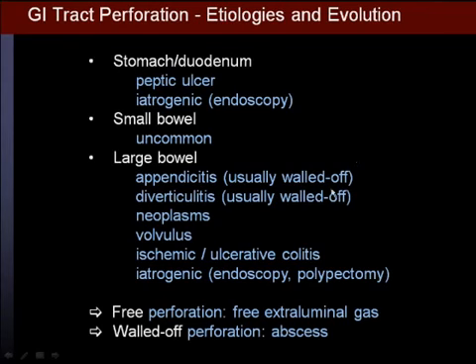Free perforation is rare because they are covered, walled off by adjacent anatomic structures like omentum. And of course, perforation may also occur in these pathologies.